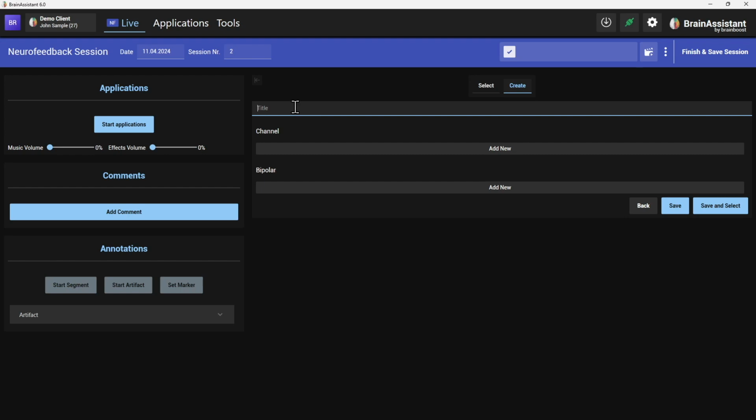What is the order of the positions? So let's say we go C3, CZ, C4. Last time I used Y shape, the Y shape F3, F4, CZ, PZ, which is pretty nice. Today, different example. We will come to bipolar, don't worry.